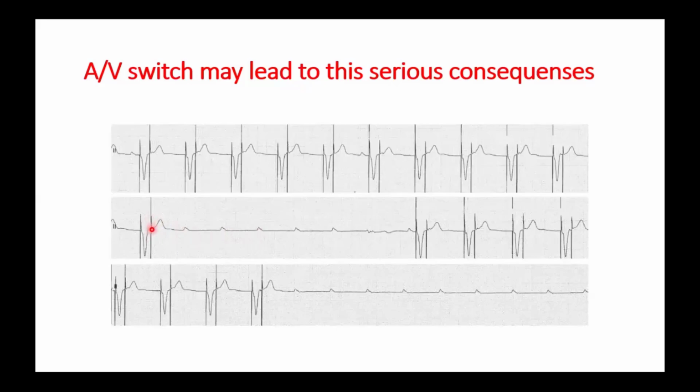So actually the ventricular lead, the second one, senses that as V sensing, V sensing, and V sensing, and V sensing, like VT. Is it clear or not? Not clear. Okay.